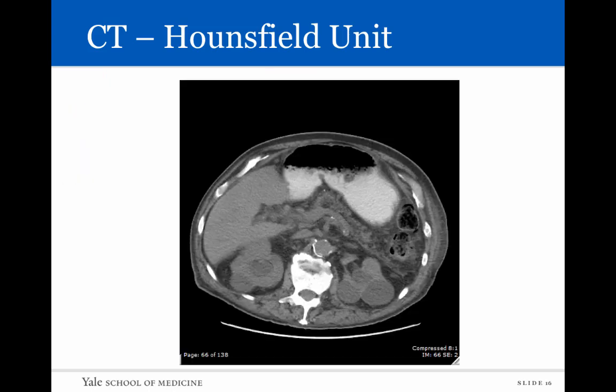And so let's see how we can use this practically. Here we have a CT scan. The patient's lying on their back. This is the gantry. That's the right side. That's the left side. We can see the aorta is a shade of gray over here.